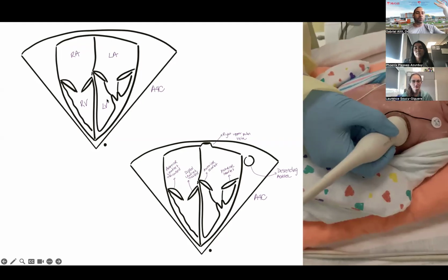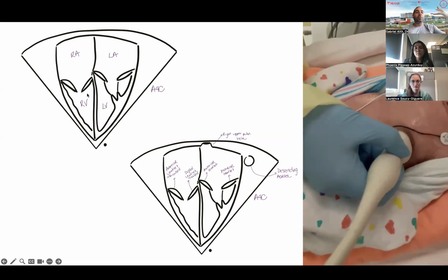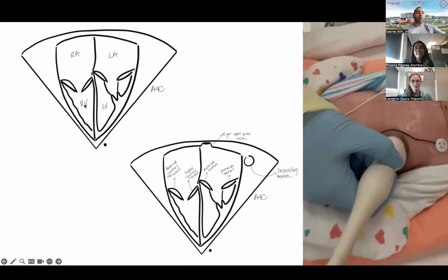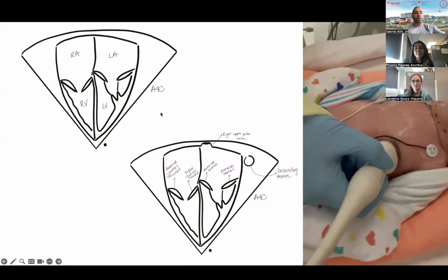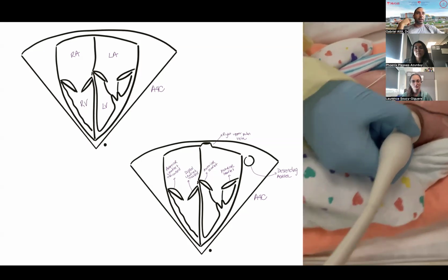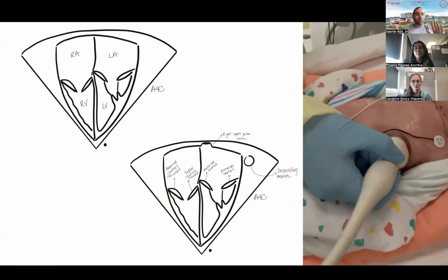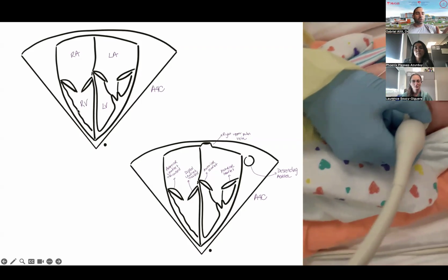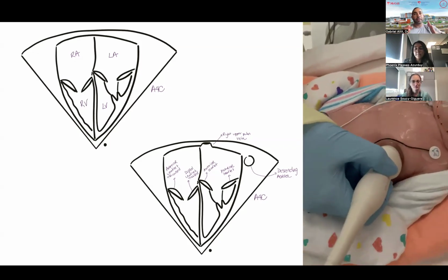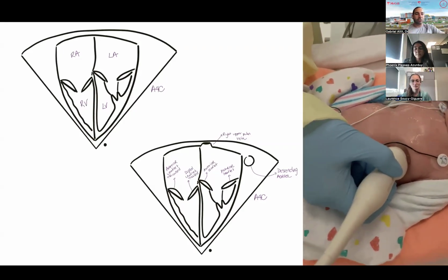which, as it tells, has four chambers, which are typically the right atrium, the left atrium, the RV, the LV. And you obviously want to make sure that you have a right ventricle on the right side and a left ventricle on the left side. Although it's called a right ventricle and a left ventricle, it's not related to their position within the body. It's really related to their morphology and conformation. So typically, the RV is more trabeculated most of the time, unless there's severe RV dilatation, where sometimes you can lose some of these trabeculations because of the dilatation.